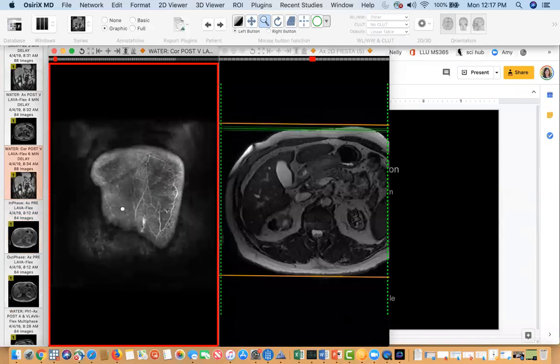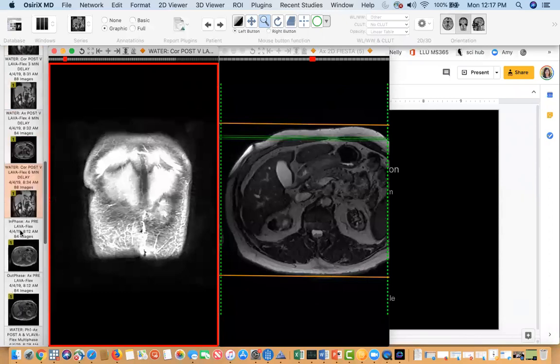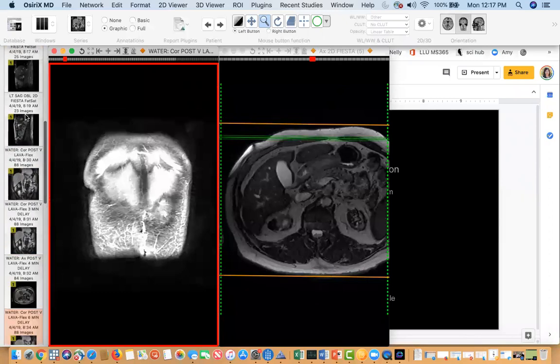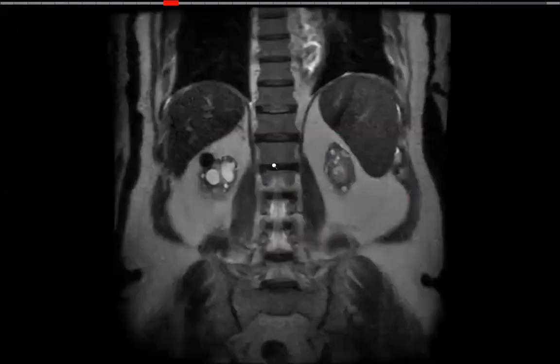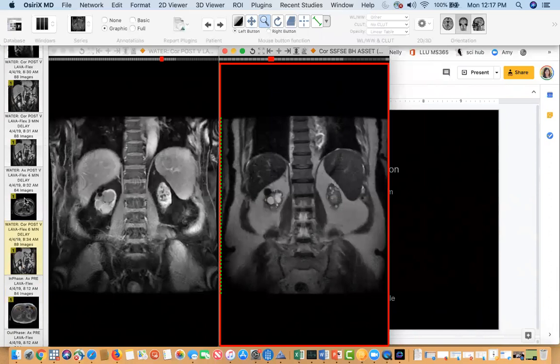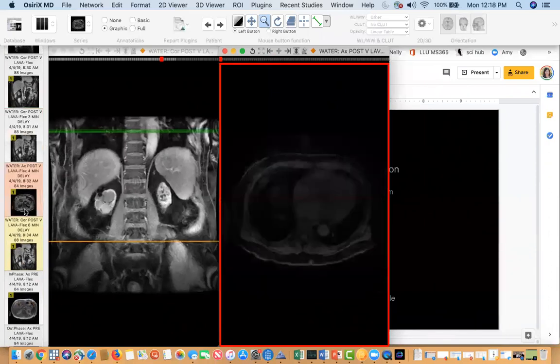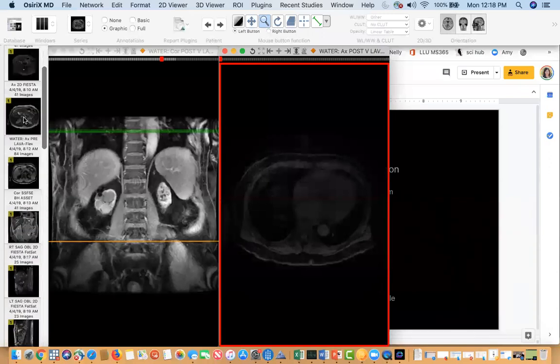I thought it was like a fibrous lesion because the T2 is so dark, and you just don't expect it to be that dark. I think it depends on the state of the blood. If it's really dark on both, it's different blood. I would have actually thought maybe it was potentially calcified or has a lot of iron in it. The CT showed it wasn't really calcified, but did it bloom on the in phase? I don't remember. It didn't have calcifications on the CT. Right, but it could still have iron. Oh, I see. That's a good point. I didn't think about that.